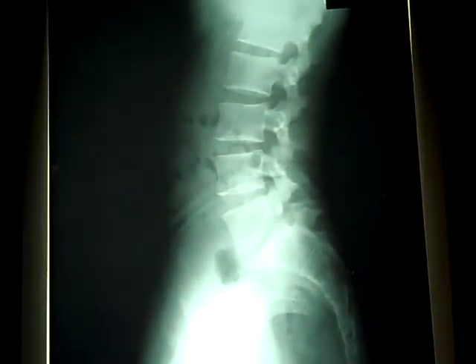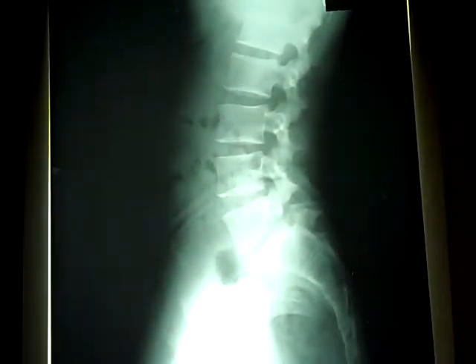And so we are going to do a lumbar film for a thoracic view, which I didn't bring a thoracic view home with me, but you would do it exactly the same way, except you would use the superior vertebral end plate of T1 and the inferior vertebral end plate of T12.